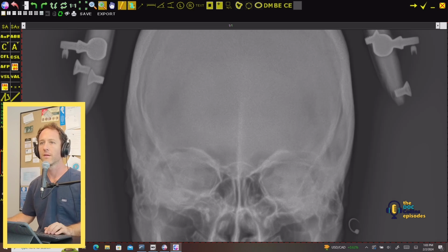So, first step when I am pulling up this frontal film, which is what we call it, is I'm trying to get a sense of where the sutures are. So those temporoparietal sutures, right? Because we're going to want to measure 1 to 2 inches above as our most reliable points for determining the frontal cephalic line, which is what it's termed.